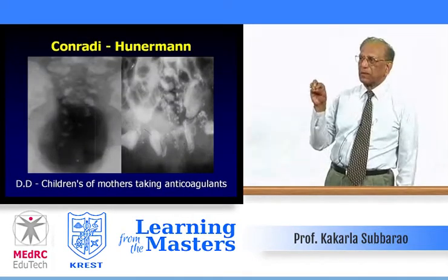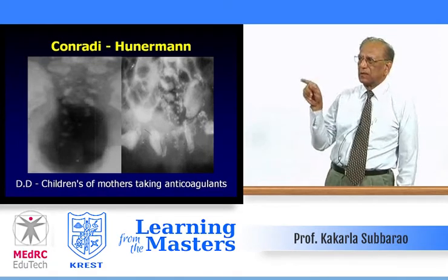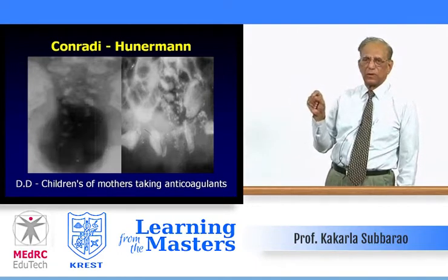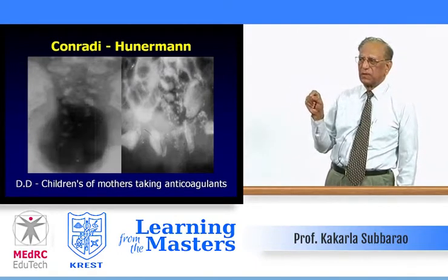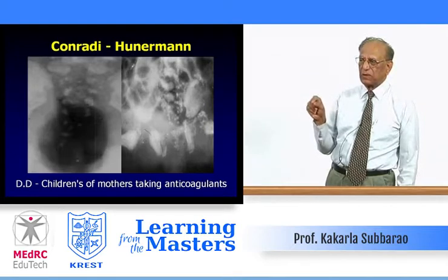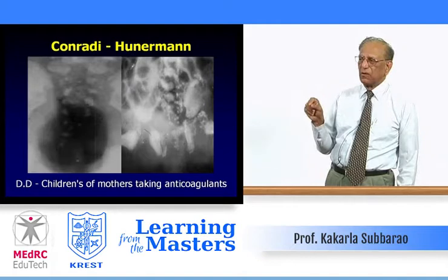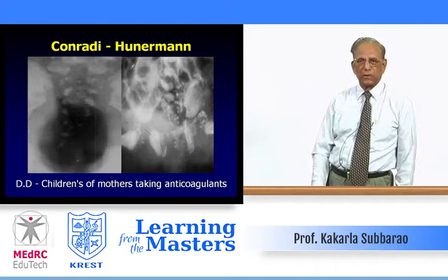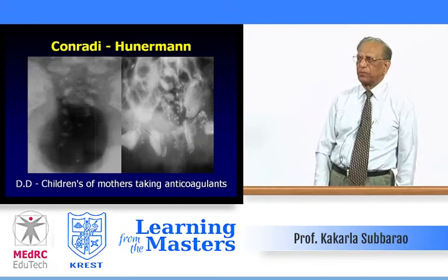See, look at the punctate type of calcification in the sacrum and coccyx, also along the iliac crest, along the vertebrae, heads of the femora. This is typical of the so-called stippled epiphyses, typical Conradi. Differential diagnosis: in children of mothers taking anticoagulant therapy you may also get the same thing. Again, there is spontaneous regression in most of the cases.